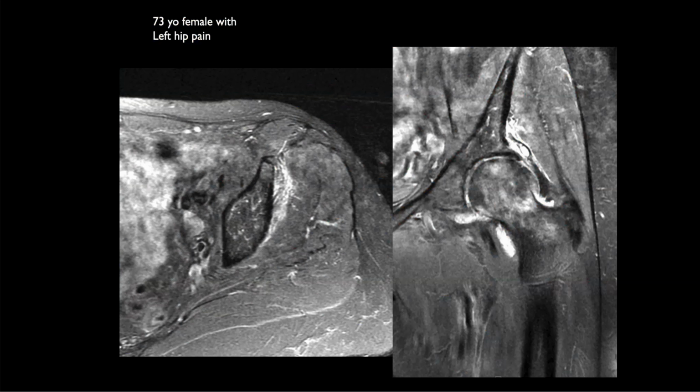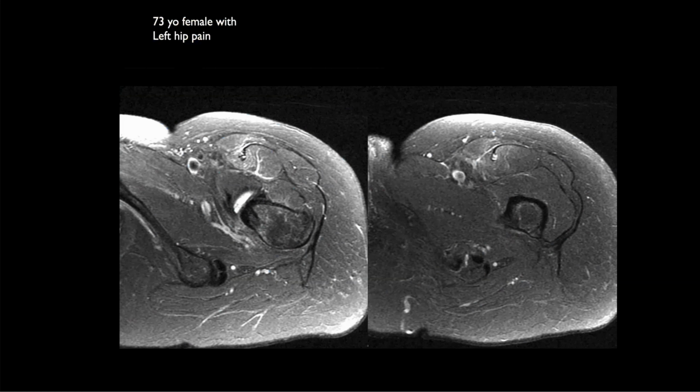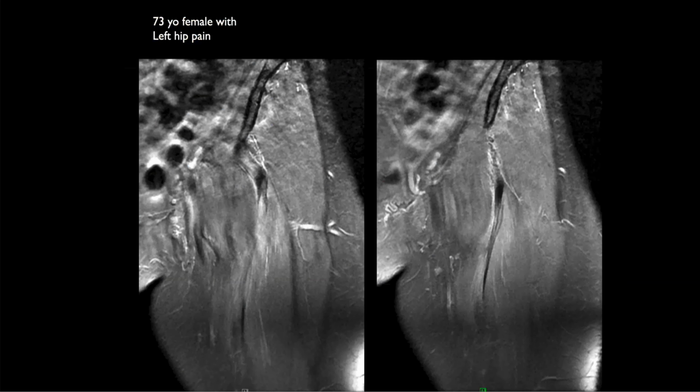Tayson? All right, 73-year-old female with left hip pain. Looks like you have an avulsion injury of the indirect rectus femoris head there. Yeah, I didn't mean to put this one in here. You're right, exactly. So that's an indirect head tear. And then here in this case, we can also see some musculotendinous injury, and we can see muscle injury here coming along the rectus femoris.